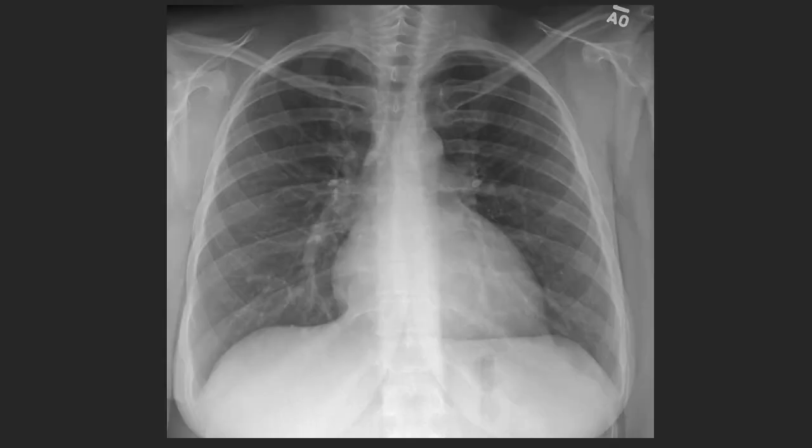So now how do each of these structures represent a cardiac contour on frontal and lateral radiographs of the chest? Let's start with the right heart border. The right heart border, remember, is going to be formed by the right atrium. And then we have this border just above the right atrium. That's not going to be the SVC, even though the SVC goes into the right atrium. Remember, this is the portion of the aorta, the ascending aorta, that's swinging from right to left. So this represents your ascending aorta. And then we have our aortic knob, which represents the aorta running from anterior to posterior.